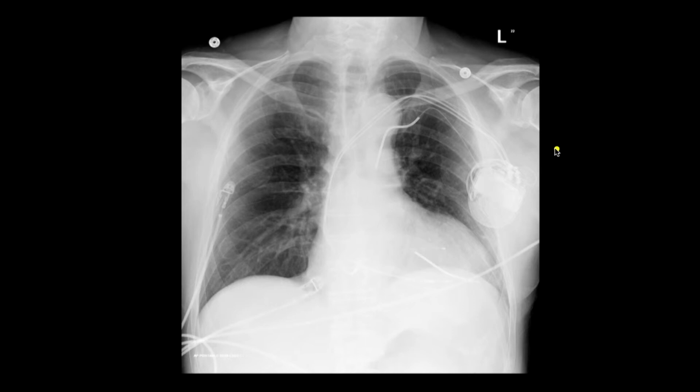So this patient has a pacemaker device, so you can see that the 2 main pacing leads pass in a satisfactory direction, but they also had one of these automatic implantable defibrillator devices, so you can see that they have a slightly thicker appearance here, and this is a defibrillator device, which would normally pass along the same path as the other leads. And you can see this one actually goes into the aorta and passes through the aorta into the left side of the heart. And again, this is not obviously an optimal position for actually defibrillating a patient, so unusual appearance there.